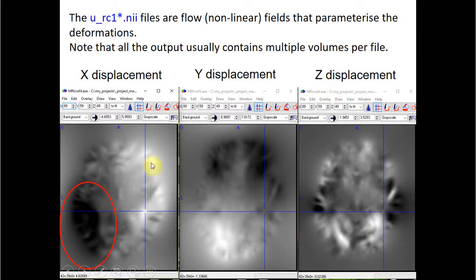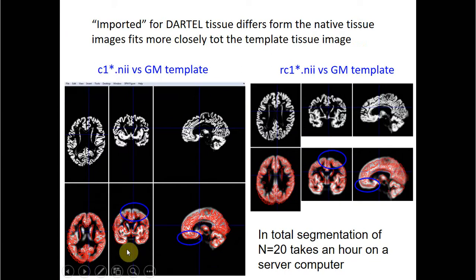If you remember, we can go back. You see this black spot. How did it come? It comes obviously from this nonlinear deformation of the original brain. You see, it bumps up here in the occipital cortex. And obviously you have to push it in.